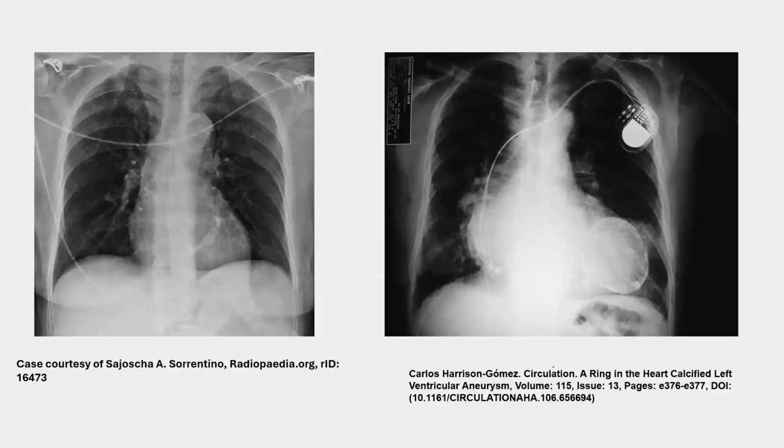Is it pericardial calcification or something else? This one. When the patient is having an ICD, okay, and how do I know this is an ICD? Because there are coils, you see. It's not so clear here, but you also have to know which device this is based on chest X-ray. Is it a pacemaker or ICD or ICD CRT?